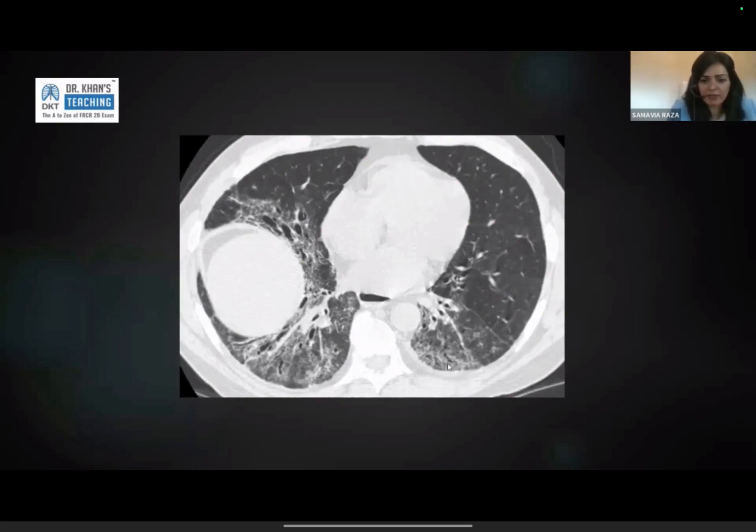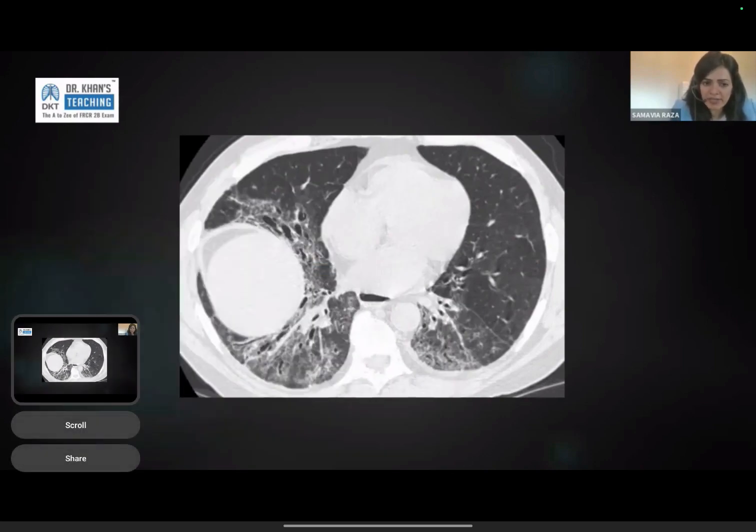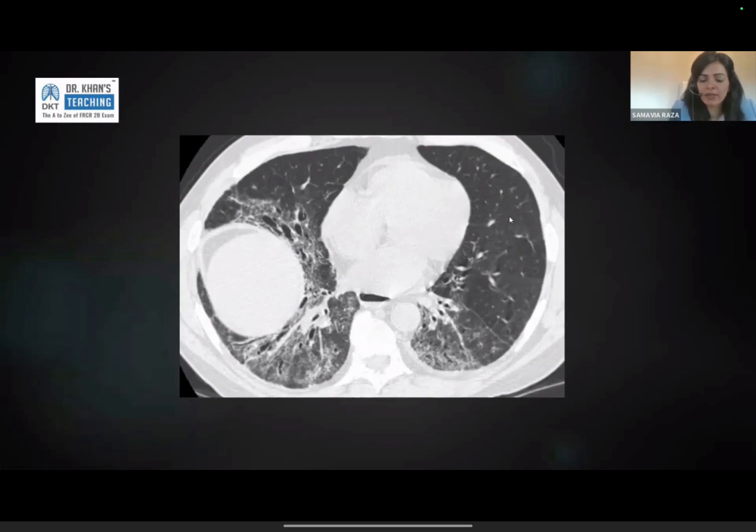But if you look at the periphery, those lines are actually just dilated bronchi, and the predominant abnormality more centrally and anteriorly is ground glass. That ground glass is clearly causing traction because the bronchi are very significantly dilated within that ground glass compared to outside it. So bilateral abnormality, the predominant abnormality being ground glass. That ground glass is clearly causing traction bronchial dilatation. Why you know this is traction and not primary bronchiectasis is because outside that ground glass there is no dilatation.